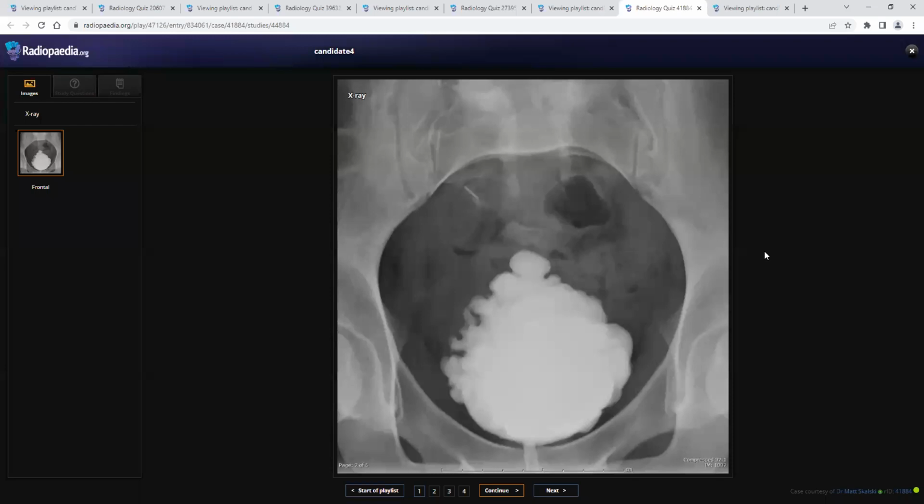Okay. What history do you want to take? Is there any neurological deficit or any known disease he is suffering from? Okay. Can you see any evidence of neurological deficit in this image? Neurological deficit, I don't see any obvious hypoplasia or anything like that. So the only obvious feature is the irregular bladder wall with the trabeculations.